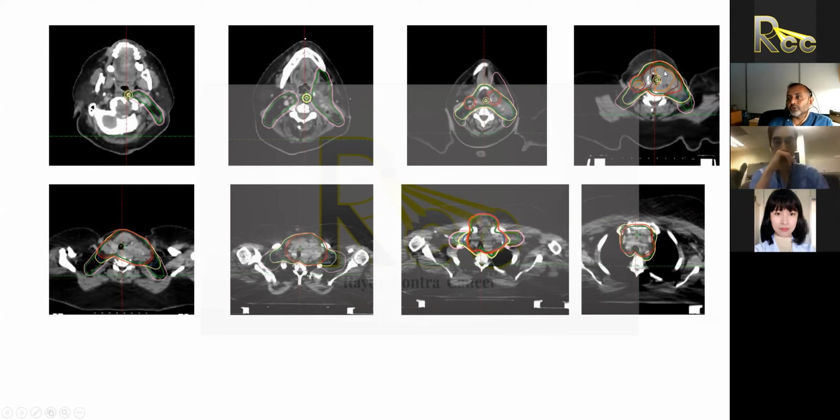So you can see now, as you're approaching the thyroid cartilage around the thyroid gland, the gland is completely obliterated by tumor. And there's a lot of extrathyroidal extension. There's extension into the musculature. And so you can see these volumes, very, very large volumes. All this is just gross disease, as you can see.